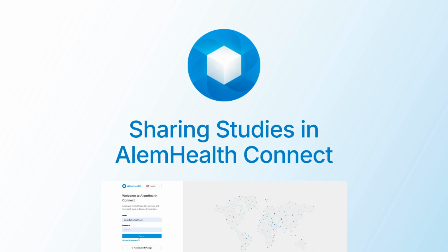Welcome to this quick guide on how to share reports in AlemHealth Connect. In this video, we'll walk you through the simple steps to securely share a finalized report with radiologists, clinicians, patients, facilities, or communities, all directly from your Worklist.